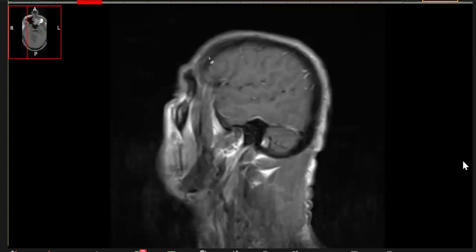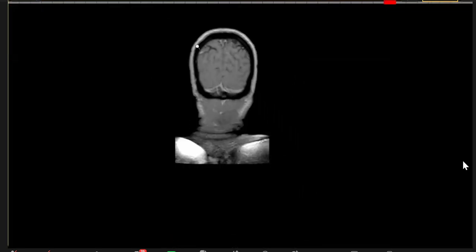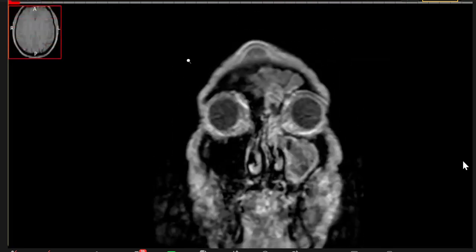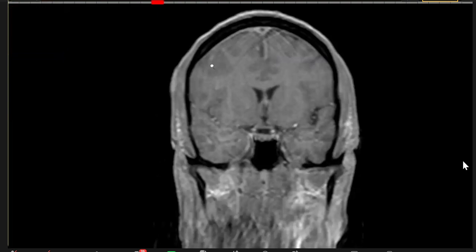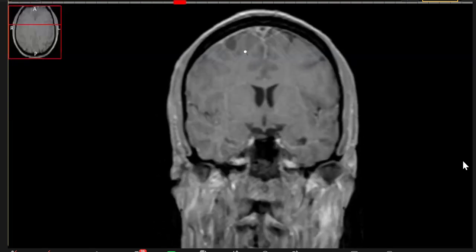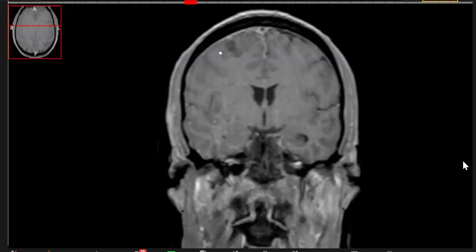I showed intentionally a coronal, where part of the finding was picked up and part of it was, I think, not mentioned. So this is the subcutaneous part, this is that abscess. Now, look at this dura, and this dura is showing enhancement. And there is some element of enhancement here. So something is happening there and something is happening here.